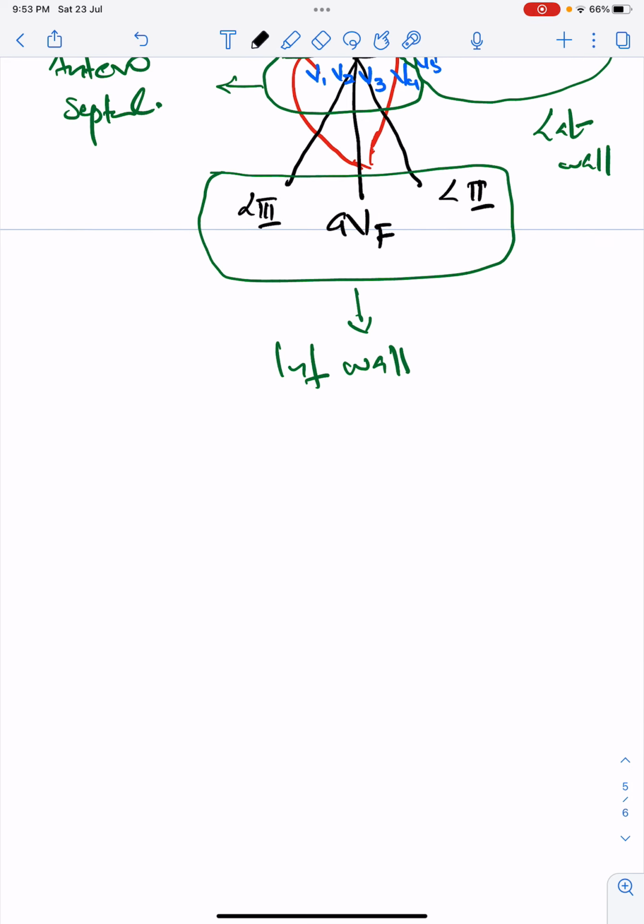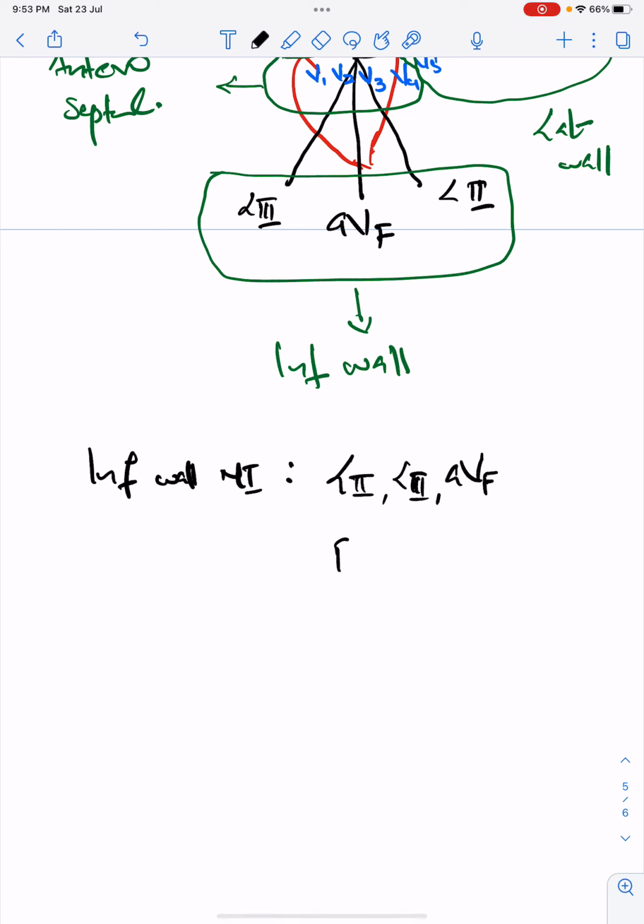So from these changes in the corresponding leads, we can predict which wall, especially in case of MI, is affected. In case of inferior wall MI, the ST elevation will be in lead 2, lead 3 and AVF, and the culprit artery will be RCA.